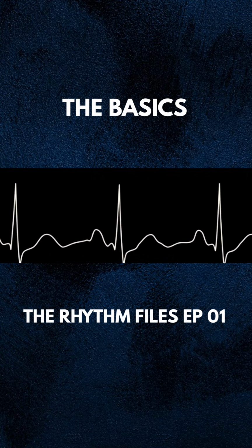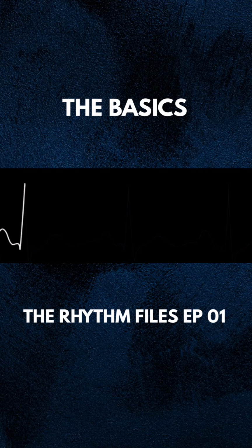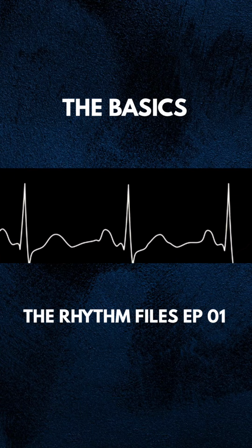In this chapter, we'll discuss the basic parameters of the ECG and we'll also see the values. So, to know what an abnormal ECG is, we need to know what the normal parameters look like. So, let's take this case of a normal ECG and let's study the parameters.